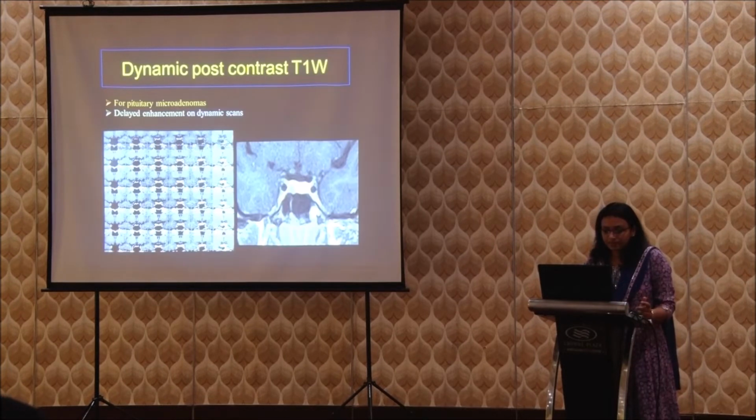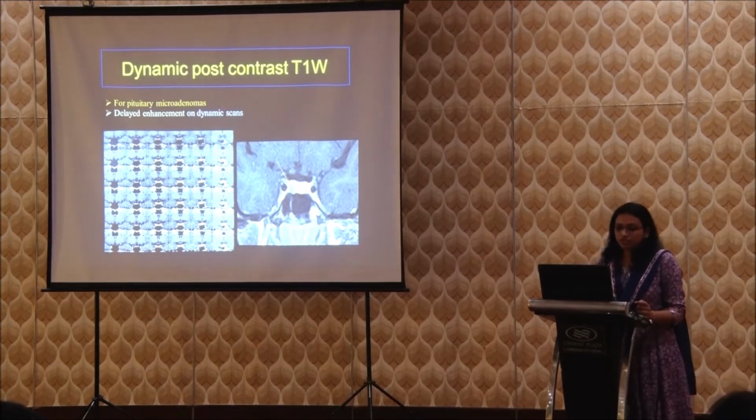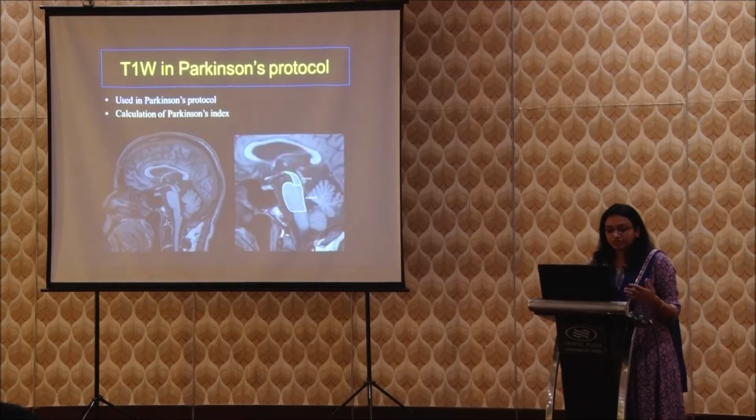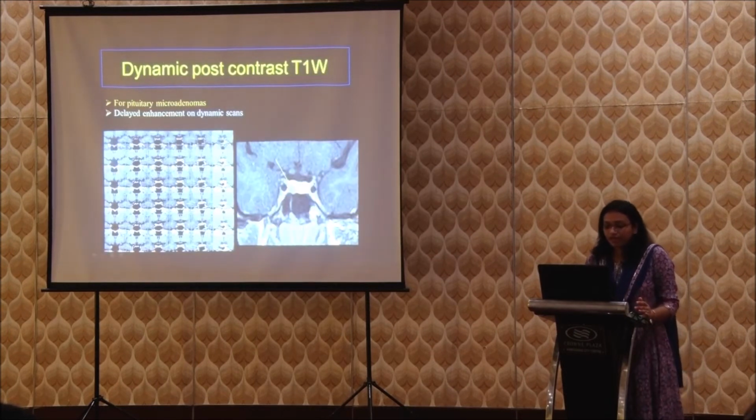Another application of T1 images is in dynamic post-contrast studies, which is particularly used for pituitary microadenomas. So we inject IV contrast and various phases of scanning are performed, and the microadenoma stands out as a T1 hypointensity in the pituitary.